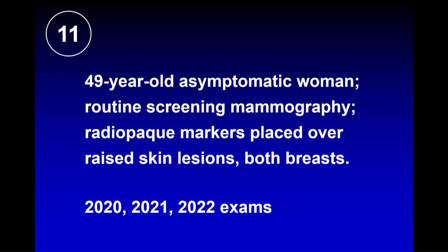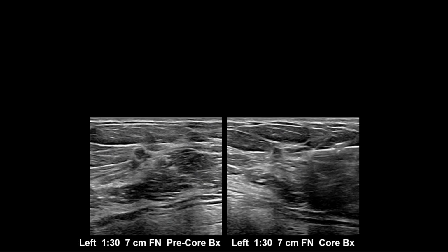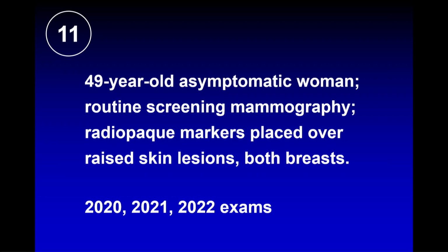And that was a high-grade DCIS. No, that's the wrong case. Forget that. That was a, where is it? Invasive ductal carcinoma. Tiny. That could have been a satisfaction of search case.